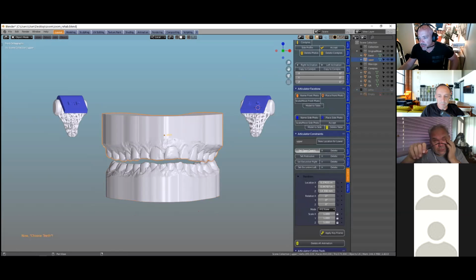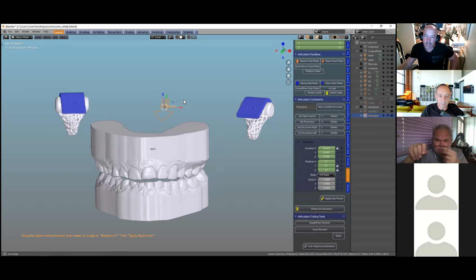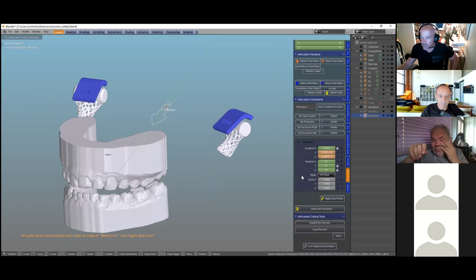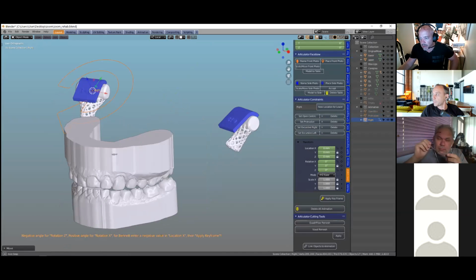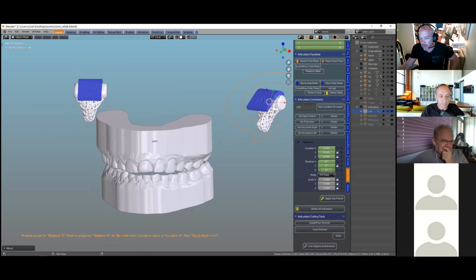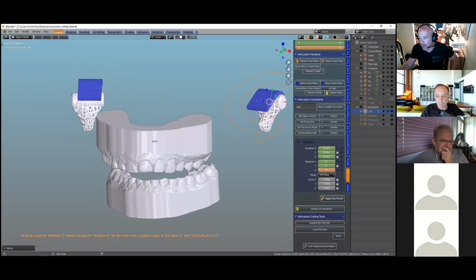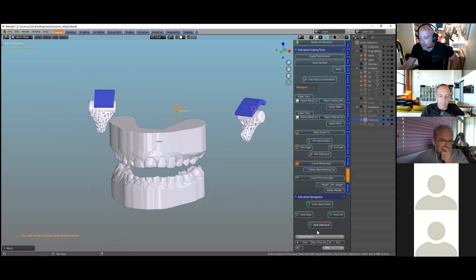So set, I'll leave it open. We'll bring this through this way. Move the jaw slightly there. Apply. And this one slightly across, and apply. So that's the articulator. We can view it and we can play.